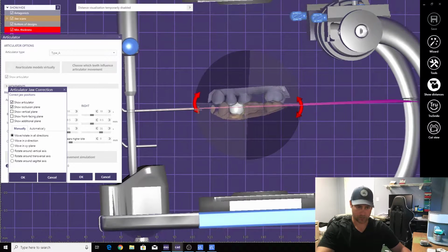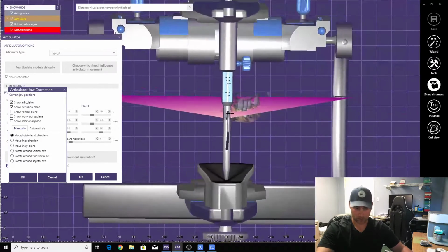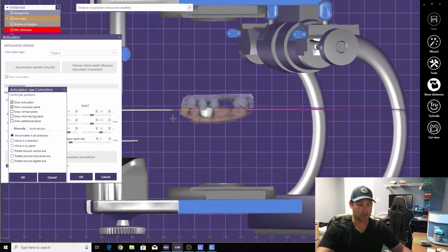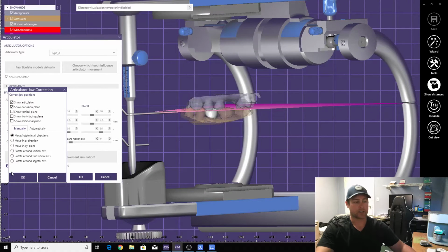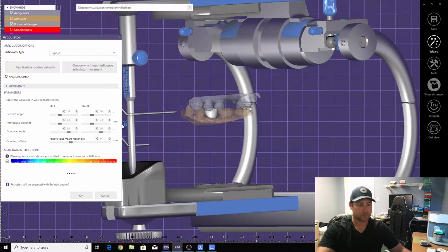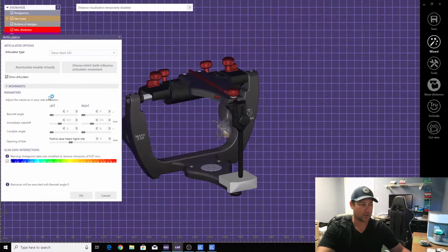And that other scan finished quite a while ago, which is oftentimes why I don't do this all at the same time, because I will forget, and that's why I don't do it. I always do them one at a time.